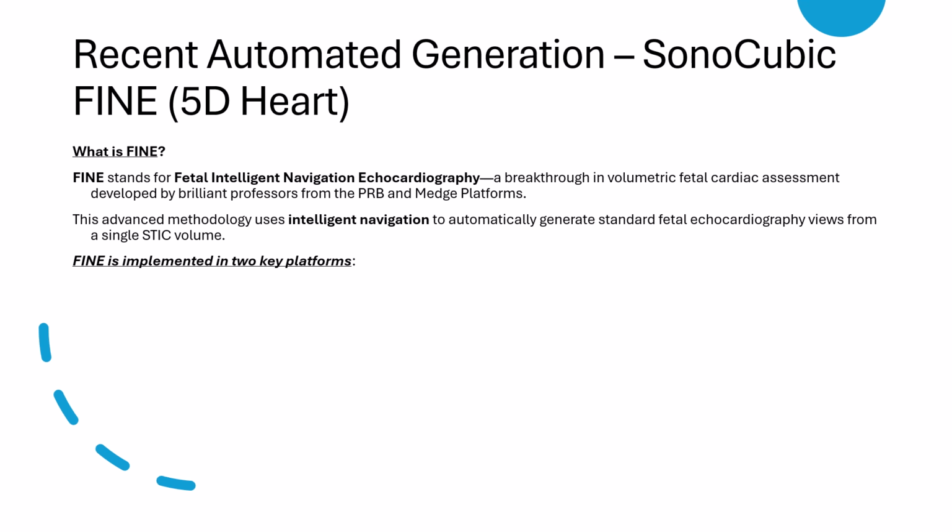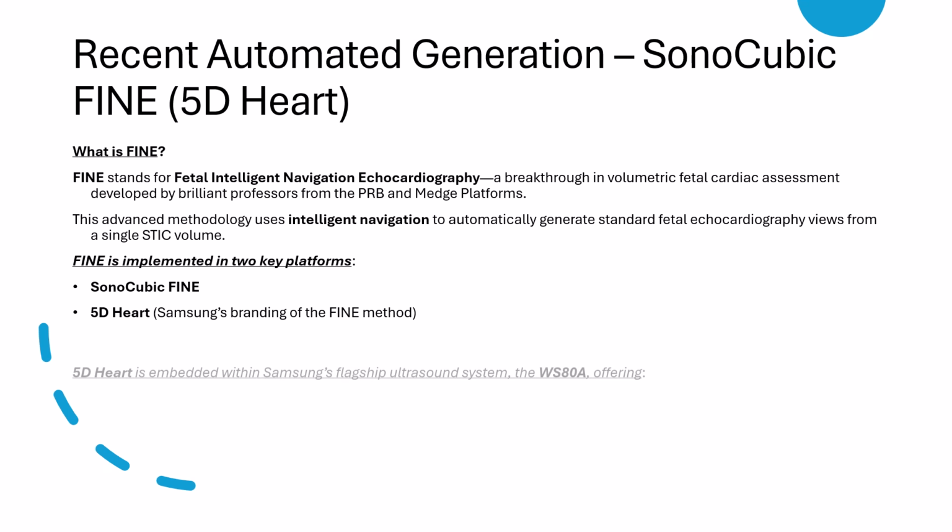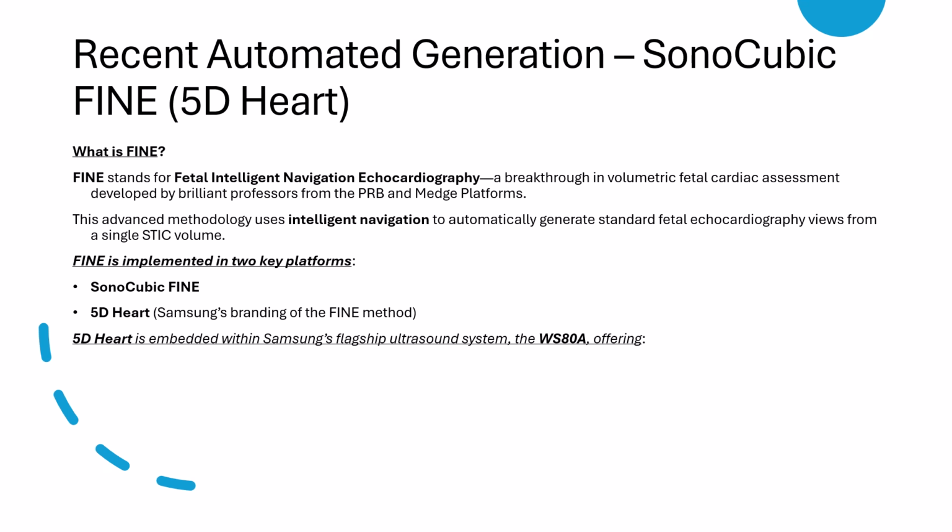You will see FINE implemented under two big names, SonoCubic FINE, the original platform, and 5D Heart, Samsung's own flavor embedded in their WS80A Elite systems. What does this bring to the table?